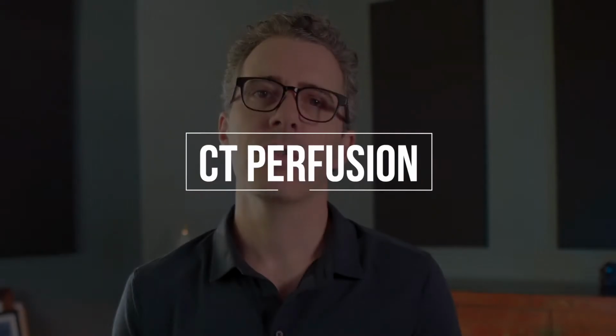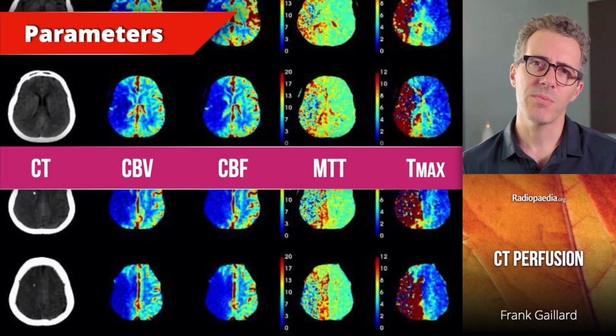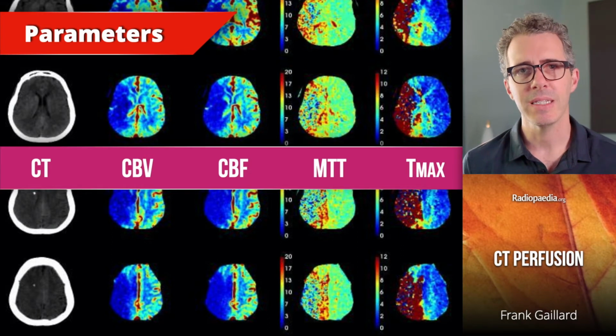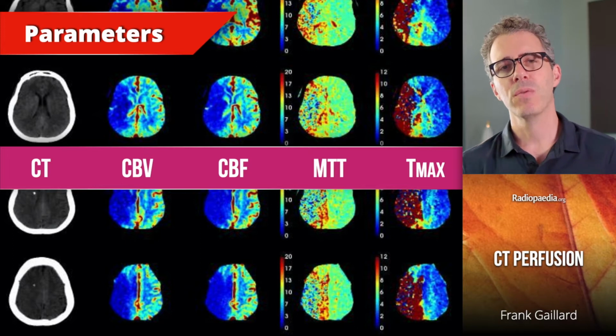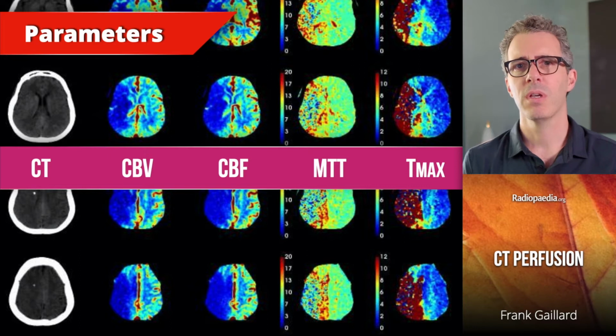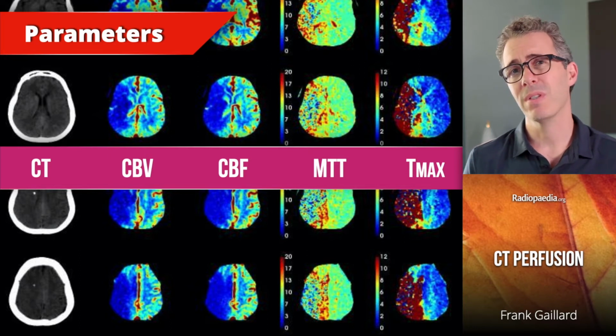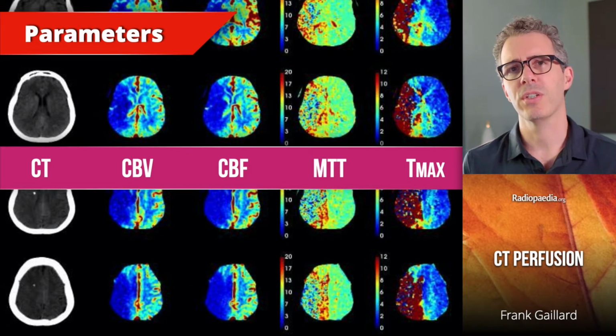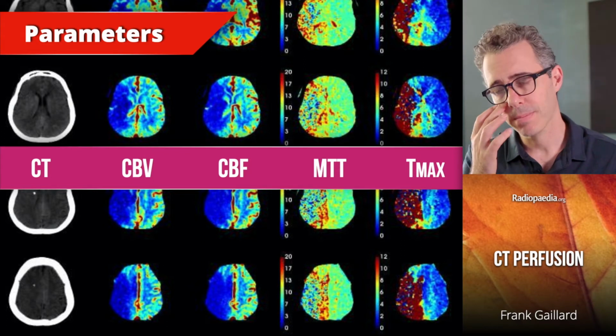Many radiologists, trainees, radiographers and clinicians alike find perfusion daunting. For one thing, the maps are brightly coloured, which as we all know freaks most radiologists out. To make matters worse, they all represent an Augean stable of acronyms, CBV, CBF, MTT, TMAX, etc. The result is that often they are ignored or reported vaguely as a mere afterthought. Often they are reported incorrectly or automated maps are relied upon too heavily. That's a shame because in a number of situations, they do have tremendous power.